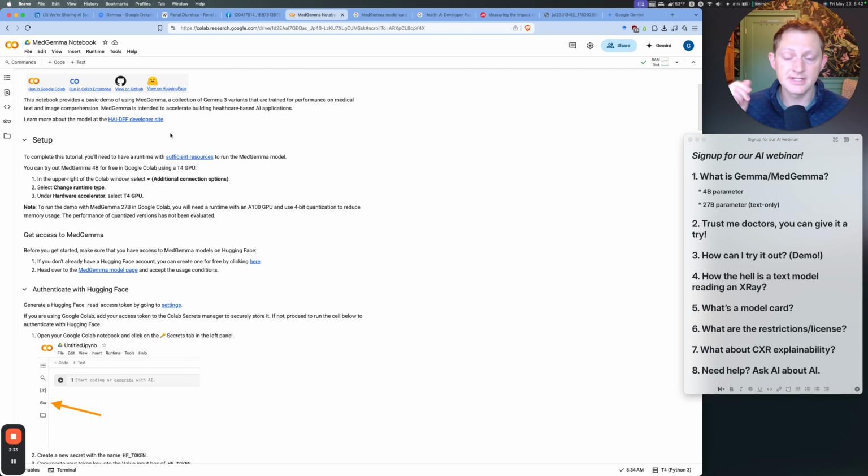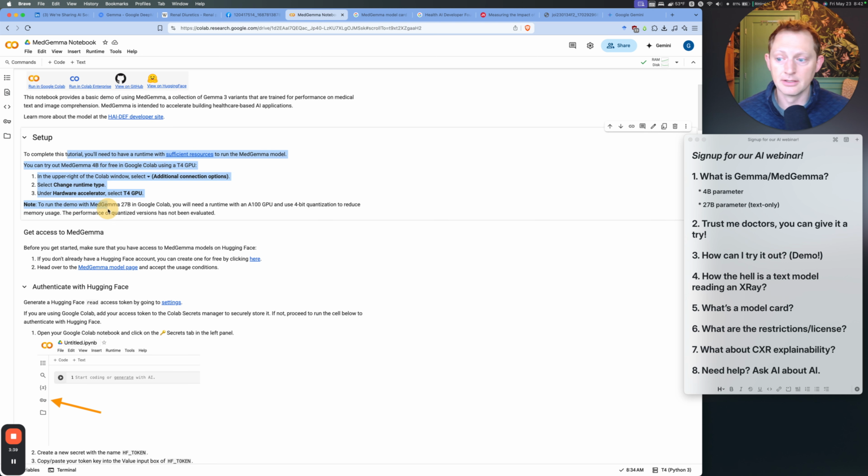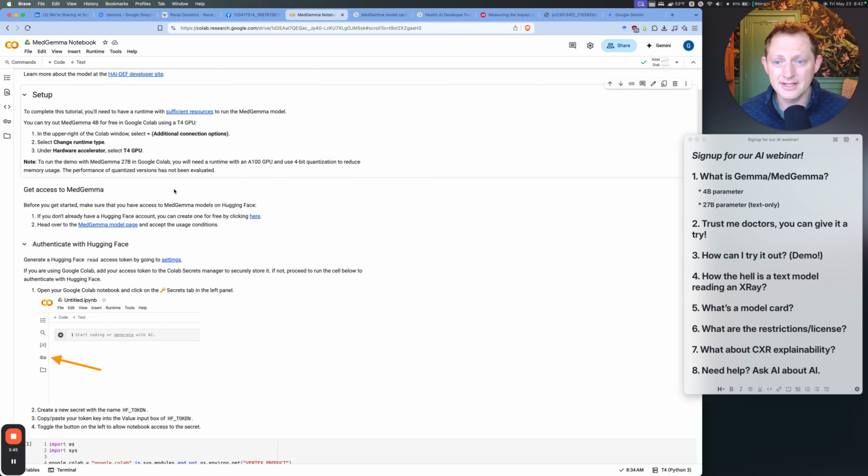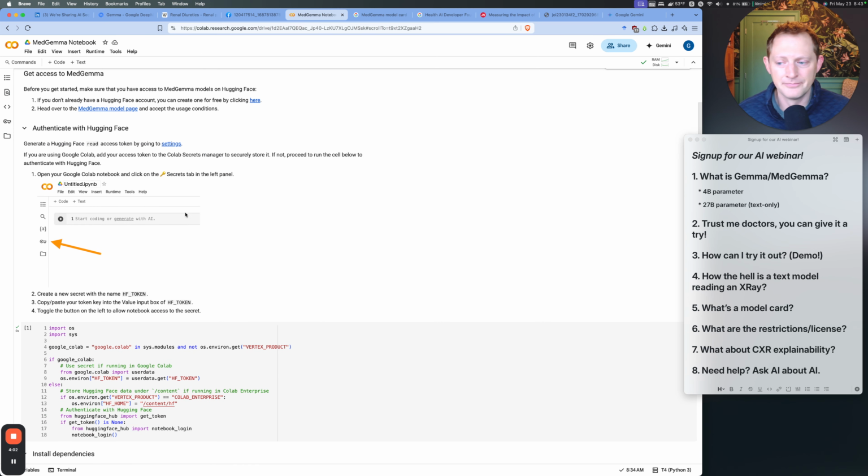Again, I'll link to this. You'll just click this link, and a page just like this will show up with your Google account, and it literally tells you every step to get this thing started. I've done some of the steps ahead of time since I'm doing this as a screencast. It does take several minutes to get it up and running because it's downloading gigabytes of information into this computer in the cloud, and then you'll have to make a little account on a website called Hugging Face. It's super easy. You've made accounts for millions of other websites.